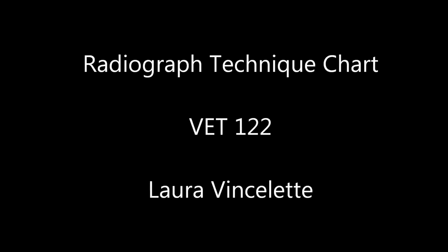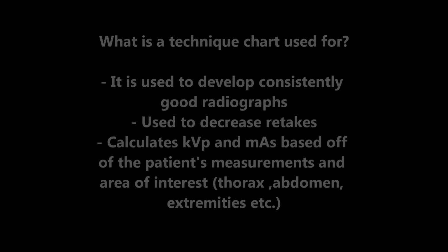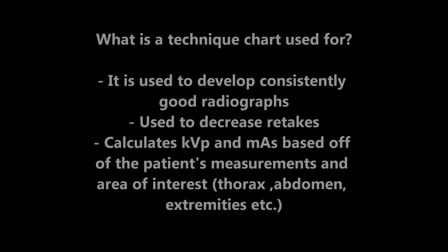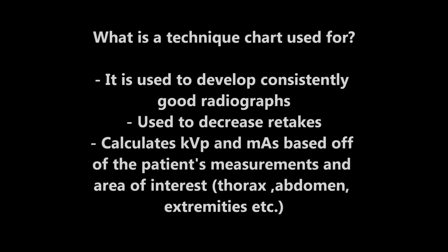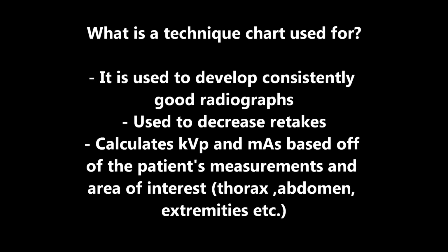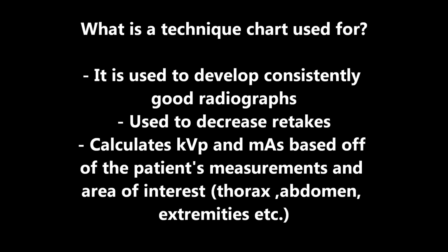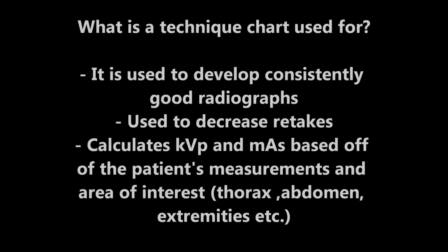Hi everyone, this is Laura at Pet Care Veterinary Hospital, and I'm going to show you how to create a technique chart. It is used to develop consistently good radiographs, used to decrease retakes, and calculates kVp and mAs based off of the patient's measurements and area of interest, the thorax, abdomen, extremities, etc.